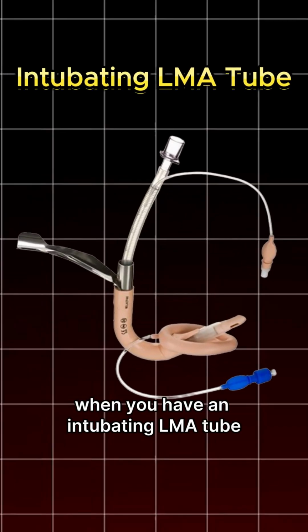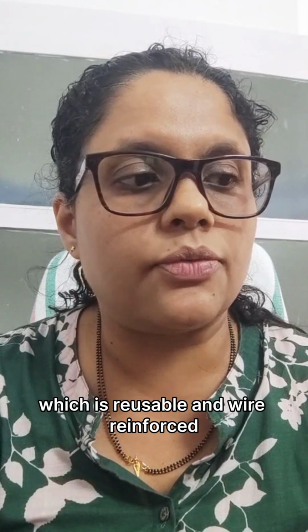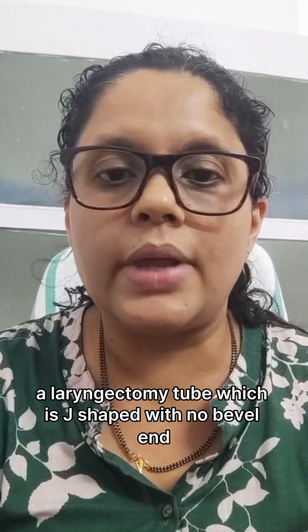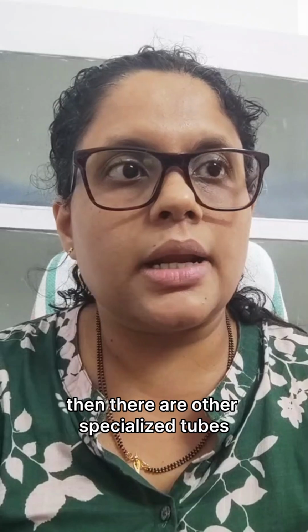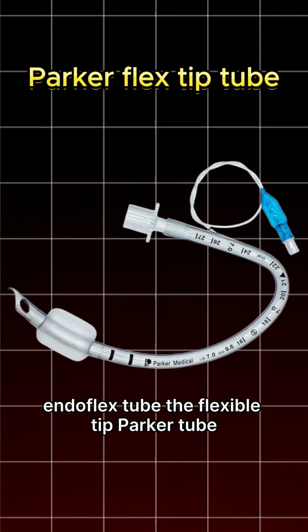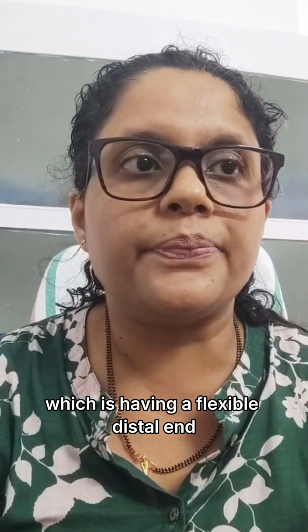Then you have an intubating LMA tube, which is reusable and wire reinforced. Then there is a Tuoren tube, which is a silicone tube, a laryngectomy tube, which is J shaped with no bevel end and inserted through the tracheostomy. Then there are other specialized tubes like the Endoflex tube, the flexible tip Parker tube, which has a flexible distal end.